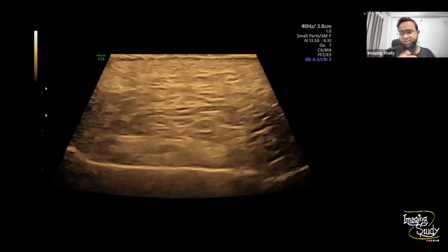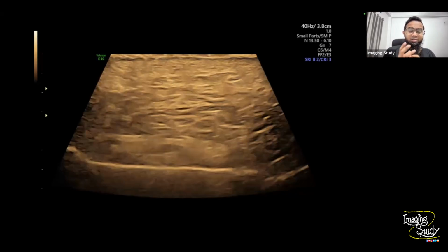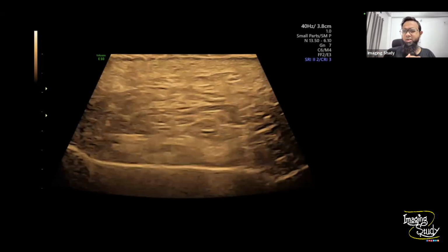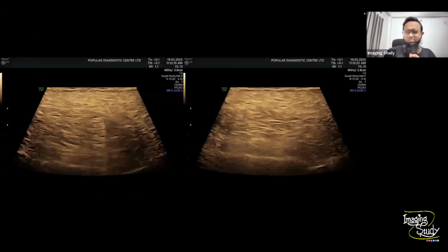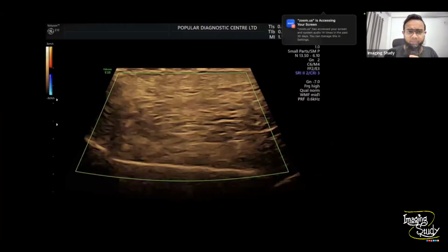Okay, so this is a very easy case, but the clinician sent me because it might be a vascular lesion also. So is it a hemangioma or any vascular abnormality going on here? There is nothing. So this is the picture. You can see this is the lipoma of this patient, which was pedunculated. It would be better if I could take the picture, but it was a private part and the patient didn't allow it. He was only 25 years old, so feeling discomfort. And we don't want to disturb the patient's privacy, obviously.